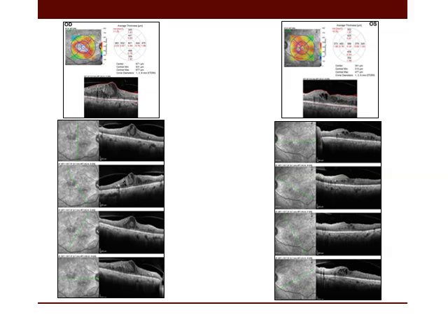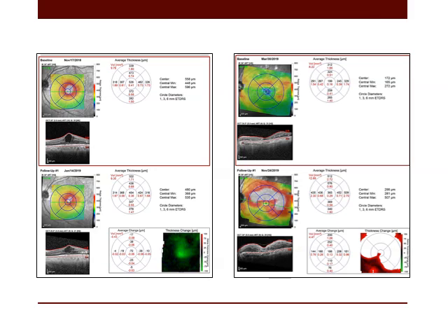The line scan shows the presence of PVD nearly all over the entire macula, which is a partial PVD, the presence of hyperreflective vitreomacular interface in this area temporal to the fovea that denotes a starting epiretinal membrane, the presence of hard exudates adjacent to the disc at the nasal periphery of the macula. The fellow eye also shows the presence of central cystic changes, the presence of complete PVD as denoted by line scans in all directions. It is very important for your device to provide you with true tracking of the macula and to obtain the exact same location and follow-up when you are going to compare.